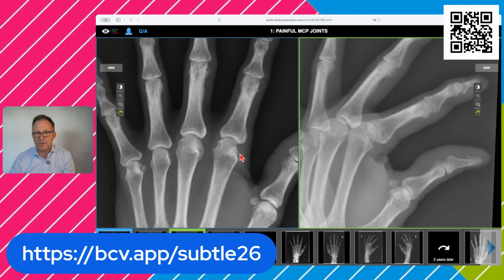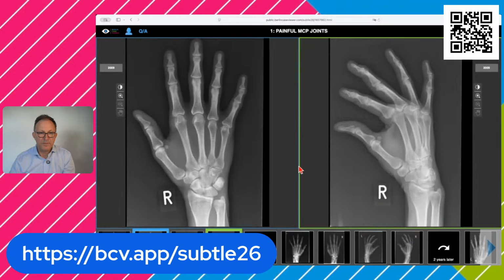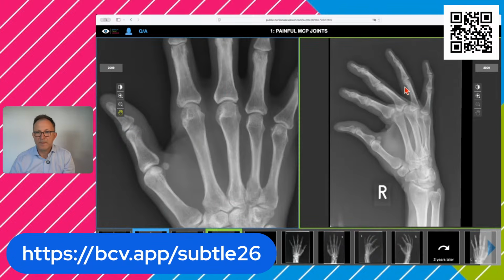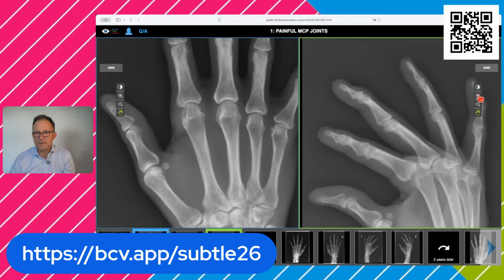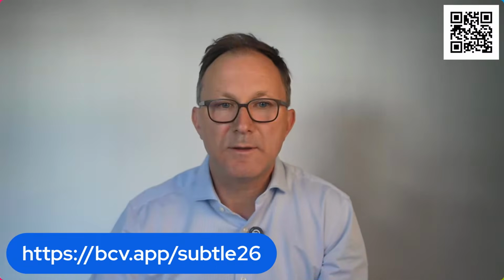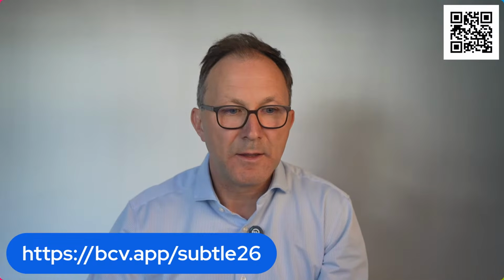So on the AP it's different, but on the oblique it's clearly visible. And also if you compare it from the right side, if you look closely here, then I think you can see the erosion as well. So we have here the cortex, and it's a slight indentation. So it's not really clear that this is an erosion, but you see something else.